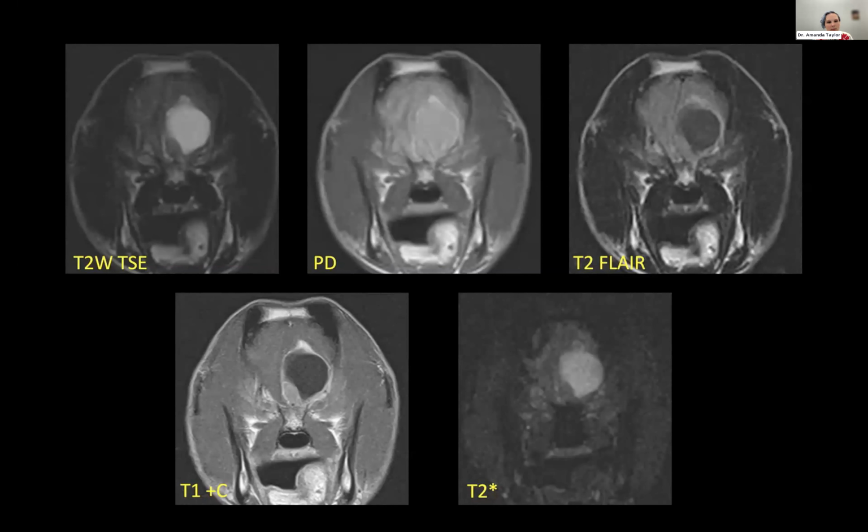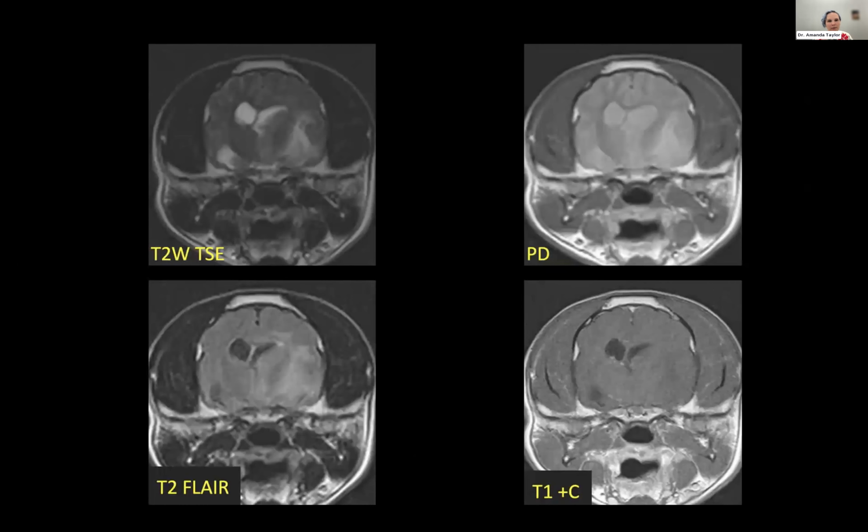So just to put those images up again that we had up in the beginning, make sure that it is relatively easy and almost thoughtless for you to decide what an image is as you look at it, but use it to compare to the other images as far as signal intensity of what you're seeing to determine what is most likely causing that lesion.